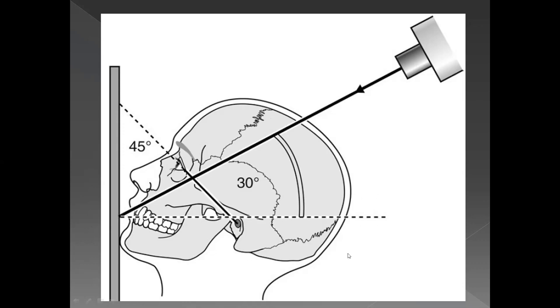All right. If you're getting confused by this orbital occlusal, this meatal occlusal line, you can just consider it as a line parallel to the floor. A line which is parallel to the floor on which the patient is standing, you can just use that as a landmark instead of this maybe confusing line. You'll be wondering how do we ensure that this X-ray beam is passing through the top of the meatus and interocclusally in the incisor area. So just consider this as the line which is parallel to the floor on which the patient is standing, right?